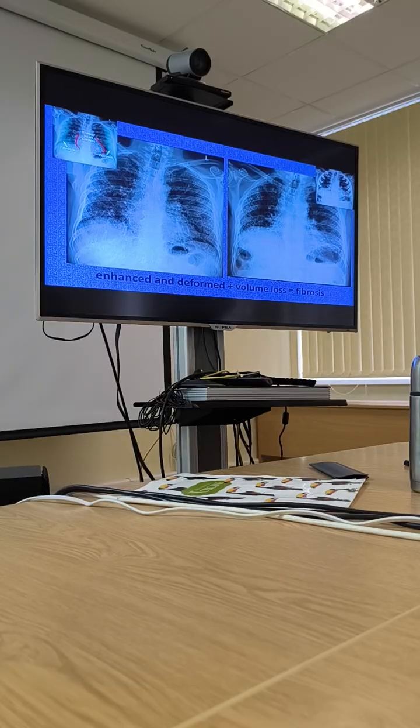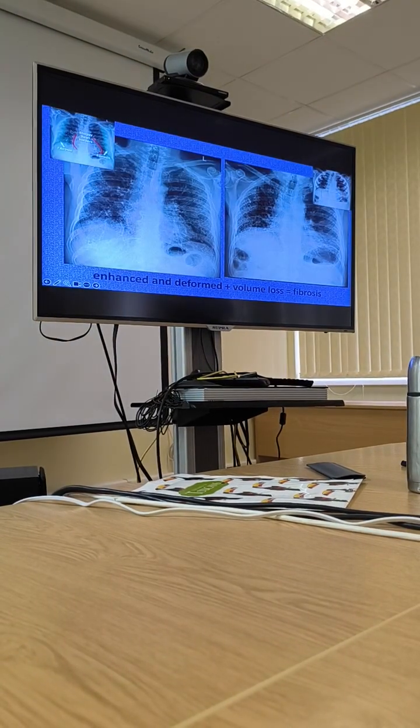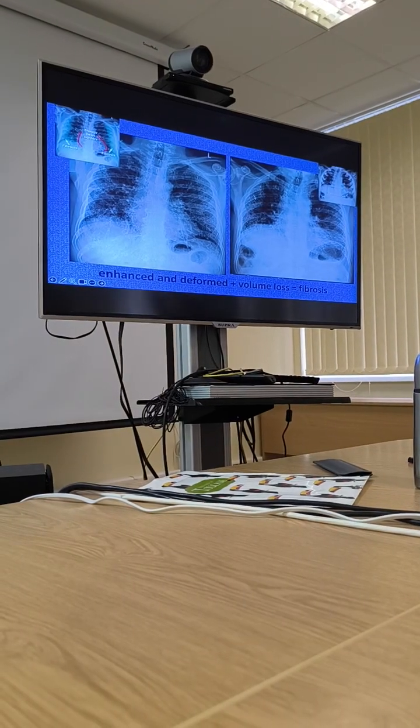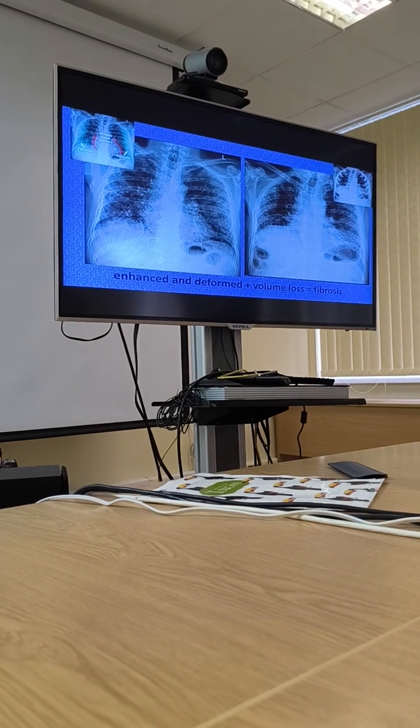And the shape of this misshaping is like something like this. How do you name it? What is it like, the bees?